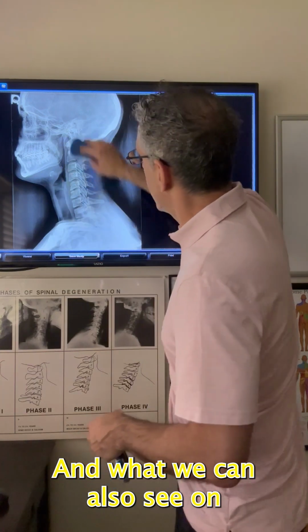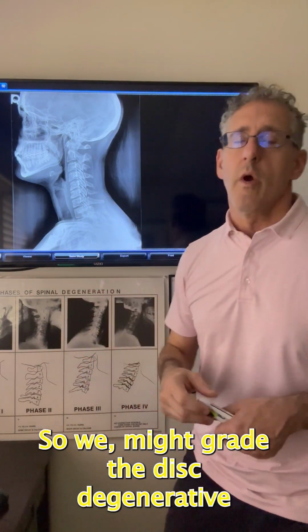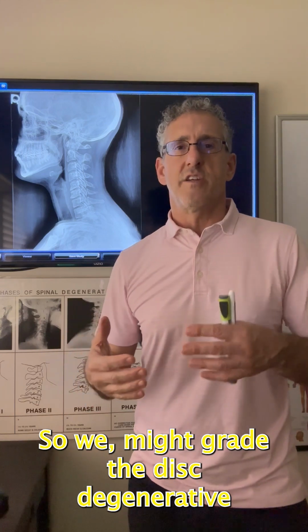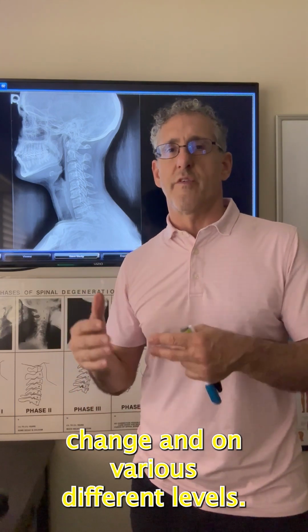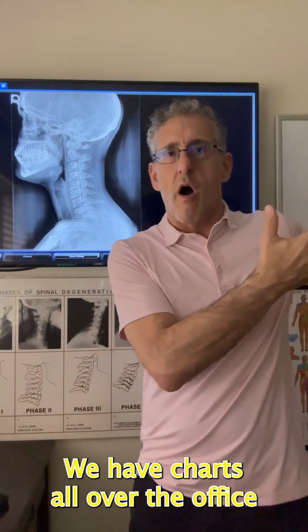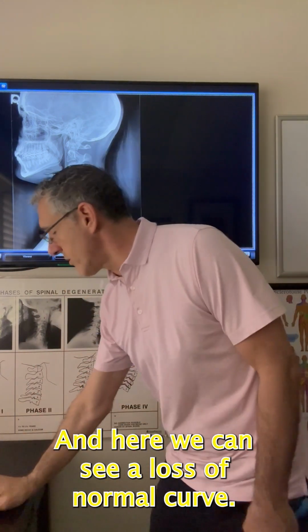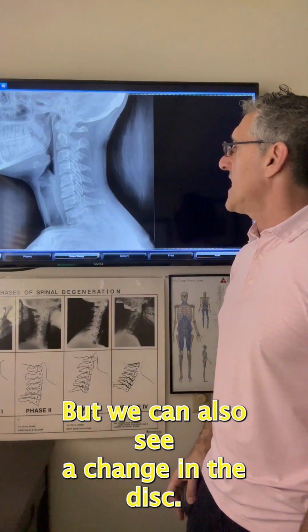And what we can also see on here is a change in the health of the disc. So we might grade the disc degenerative change on various different levels. We will compare it to normal. We have charts all over the office that show us what normal and abnormal curves are. And here we can see a loss of normal curve, but we can also see a change in the disc.